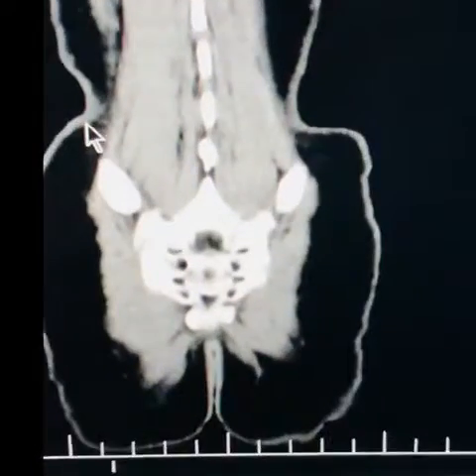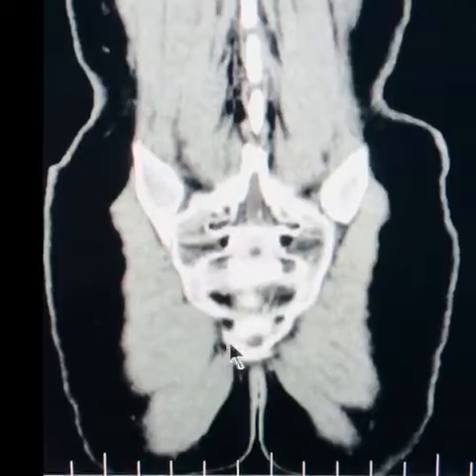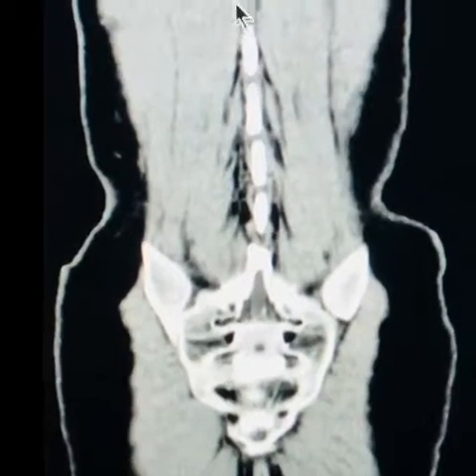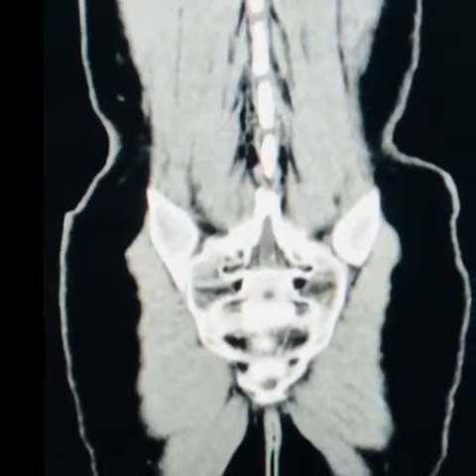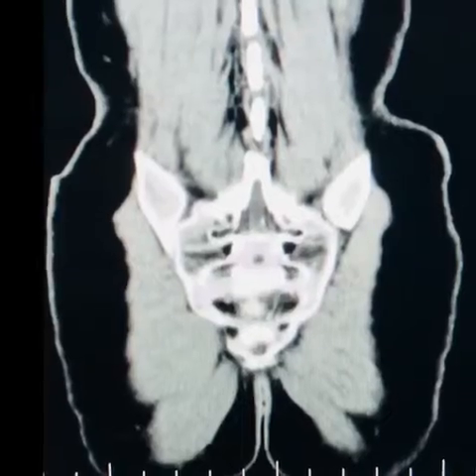First thing, we're going to start from the back of the body, and we're just going to keep going and see what we can get through in the short amount of time we have. First thing we notice is this bony structure. Everything that is white is very dense, it's very hard. The x-rays hit it and they can't pass through it, and it produces a very dense look to it.